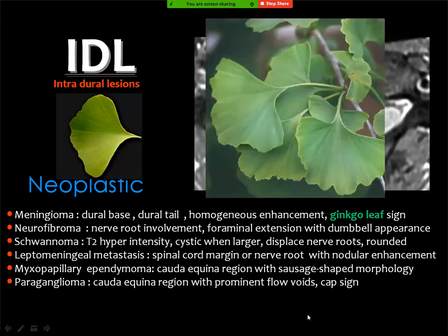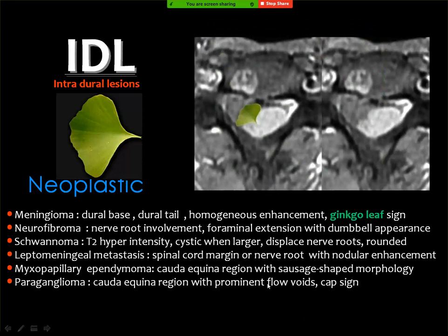Then it is written in the literature that in order to diagnose meningioma, one of the helpful signs is this appearance, which is known as the ginkgo leaf.